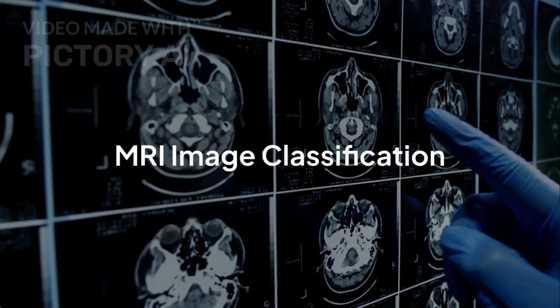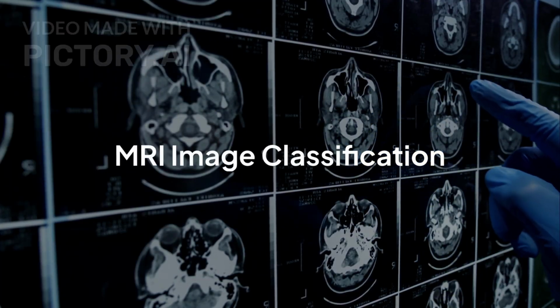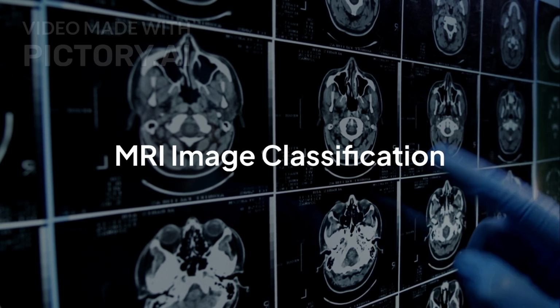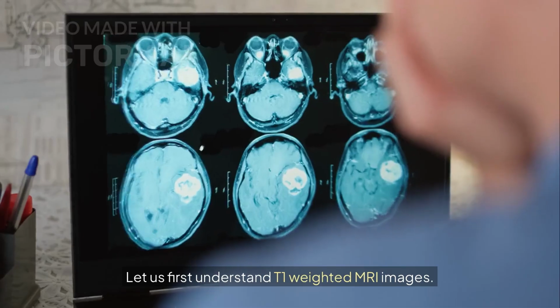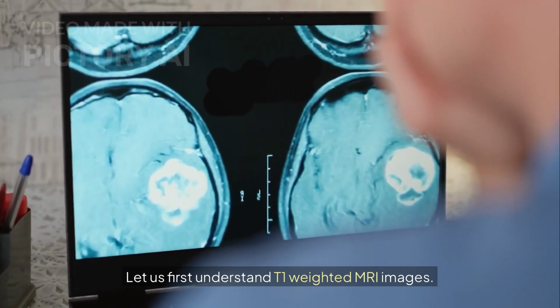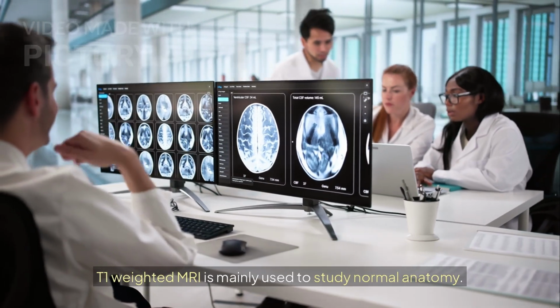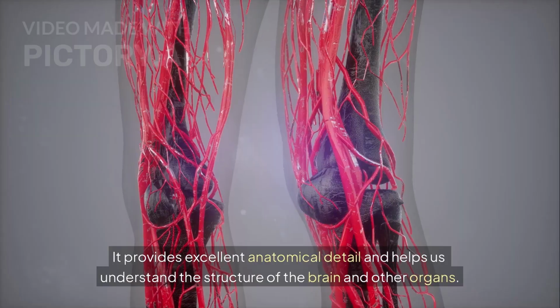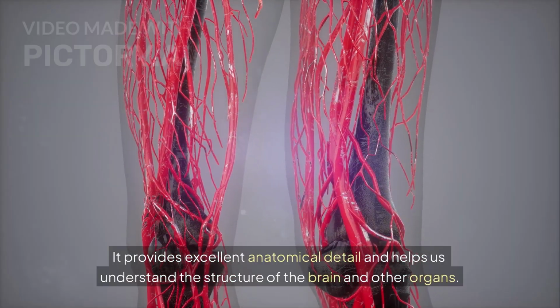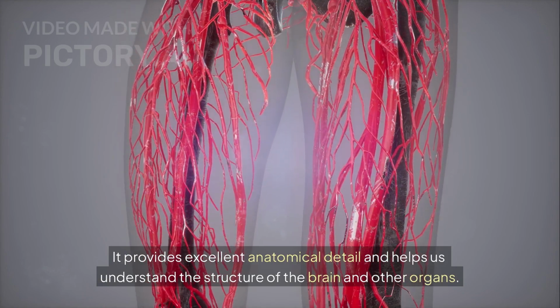MRI images are commonly classified based on how tissues appear, and the most important types are T1 weighted and T2 weighted images. Let us first understand T1 weighted MRI images. T1 weighted MRI is mainly used to study normal anatomy. It provides excellent anatomical detail and helps us understand the structure of the brain and other organs.